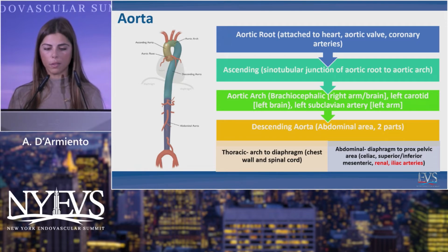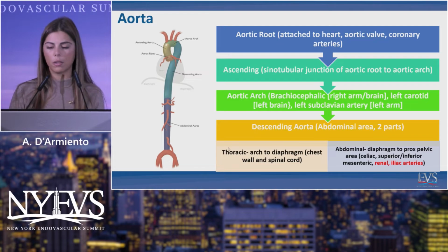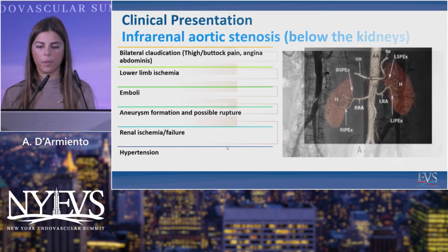If you look at the proximal aorta, you can see that there's two branches coming off right here. Those are our renal arteries, which we will talk more about. So I just want you to know where they are. And then if you follow it all the way down, you're going to see another bifurcation here, and that's where the aorta becomes the common iliacs, right and left, and we'll get into that as well. We're going to skip that for time.